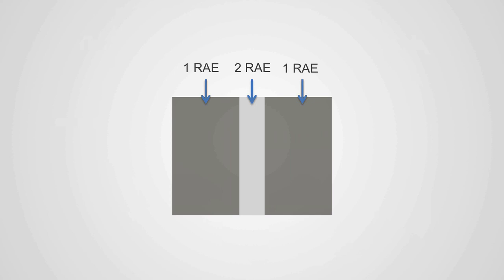In the real world, if we overlap two transparent structures, the overlap area is usually darker. However, in the radiological world, if we overlap the two structures, we see the overlapped area as being whiter. The reason the overlap area is whiter is because the X-ray beam now has to go through two structures, and because of the summation of the rays, this area looks whiter.